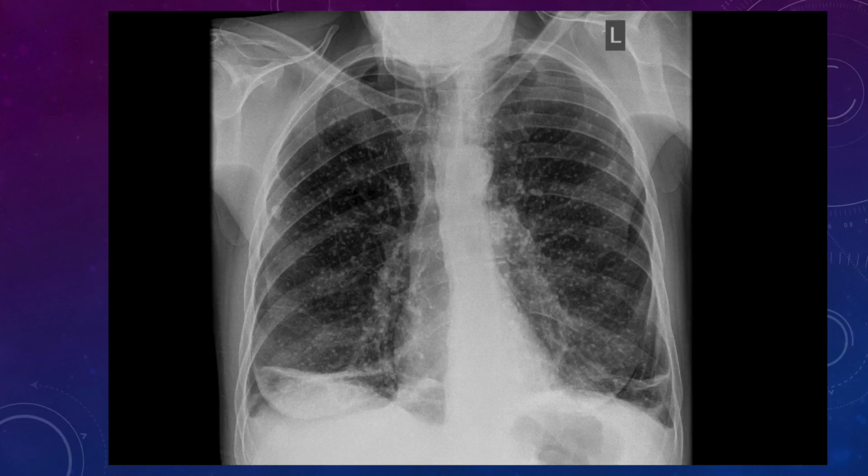So you get a shoulder film, you get an AP T-spine, and you've got this sort of calcified nodular appearance within the lung fields. You can't dismiss it, you need to think about it. Okay, we've got some atelectasis down here, or minor collapse, subsegmental plate atelectasis down at the bottom. We've got a slightly larger density here. There are multiple causes, one of which would be chickenpox. So this is varicella pneumonia that you'd be looking at. This might be a calcified granuloma.